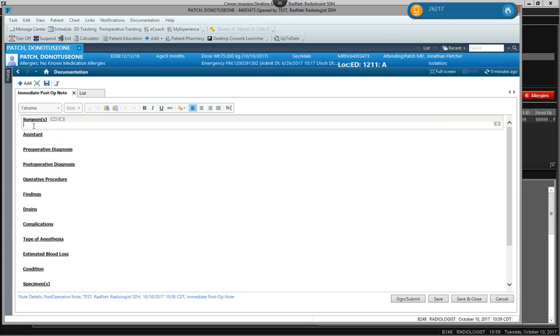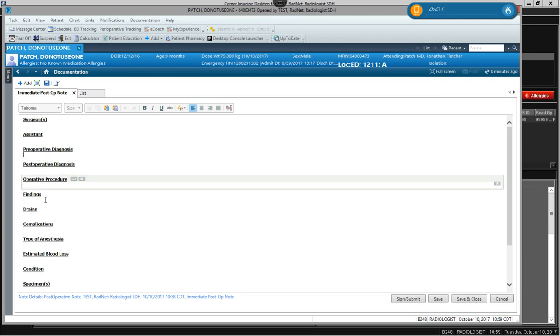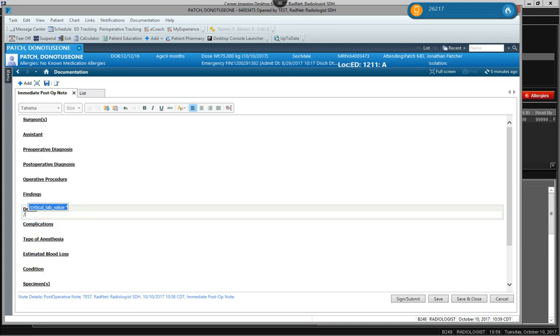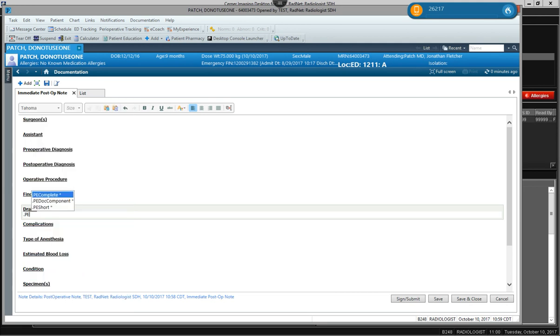These areas can simply be typed, free texted, or you can use Cerner Autotext or Dragon Autotext. First, I'd like to demonstrate Cerner Autotext. Cerner Autotext is all keyboard driven, and you'll use punctuation such as a period, comma, or a slash to bring up different templates that are known as public autotext. So just for example purposes only, I'm going to say .pe for physical exam. And I will pick the complete one here just to demonstrate.